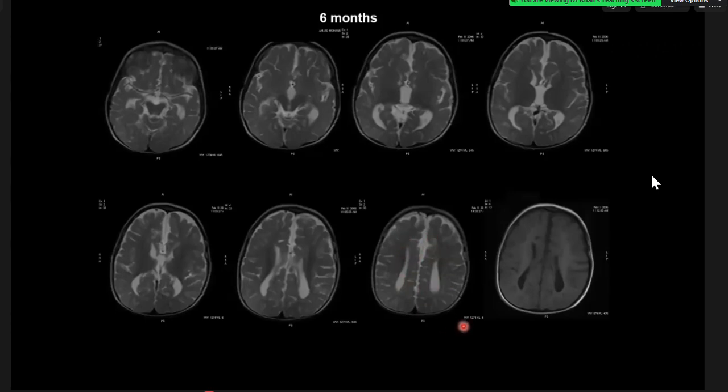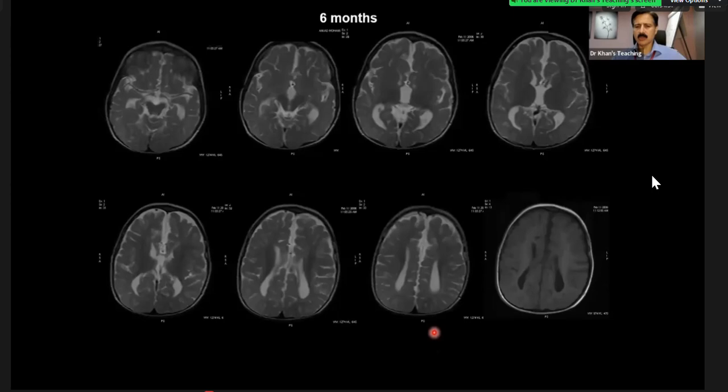Yep. So I was wondering, yeah, this is a racing car configuration. And the specific term just escapes me now. Sorry, it's a racing car configuration abnormality, and I just can't remember the name of the pathology. What is your diagnosis? I can't remember the name, sorry.